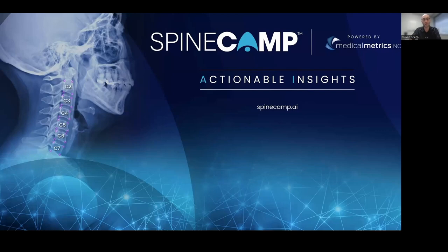SpineCAMP is a fully automated X-ray analysis software that's been designed to inject quantitative reports and enhanced visualizations directly into the clinical workflow. This software does not require any new interfaces. The results can be viewed in your native system with the standard DICOM viewer. I'll show you exactly how that works.